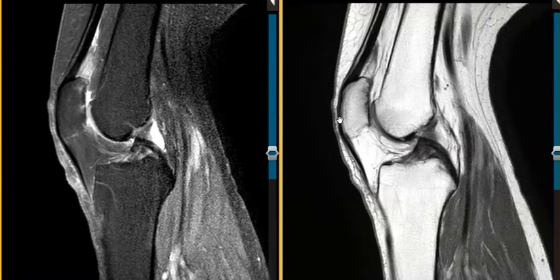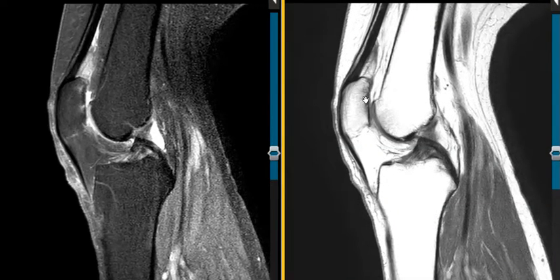So in the front of the knee, we have the kneecap or patella. It glides along in the front of this femur. The big bone here is the femur. Along the anterior surface, there's articular cartilage. It's called the trochlear articular surface. And the kneecap here glides along. And we can see that the kneecap has some problems.